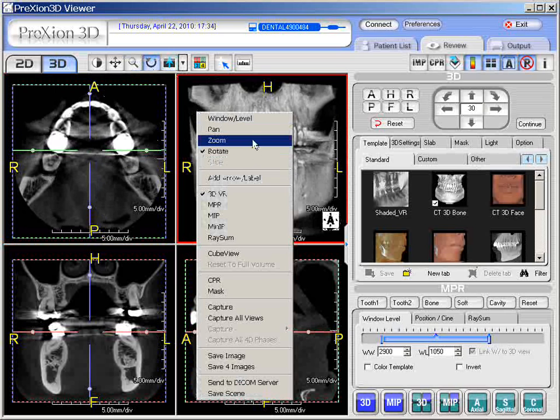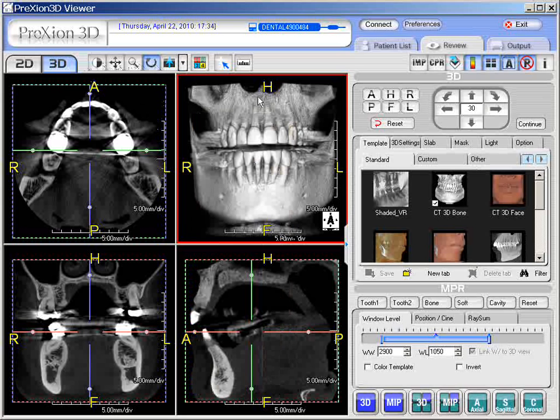One other item here in terms of adjusting the mouse at window level, you can right click it and it pops up a menu, and these first four items really correspond as well to these icons. So if one wants to choose it with the right click of the mouse or by going to these particular icons, it's all one's preference. But these again will dedicate the left click of the mouse to these functions, same as up here, or we can use the mouse independently for the functions that we have just gone over.